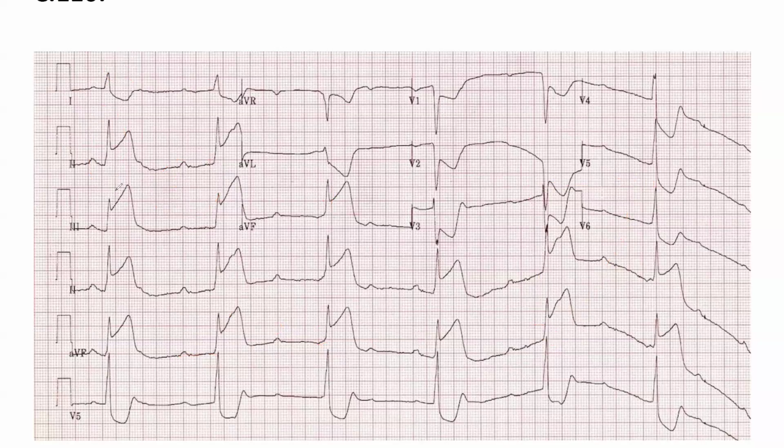And one thing, is the QRS wide? Not wide. Because from the beginning of the QRS till here, that's an ST segment, and this is a T wave inside. Next time we will practice with this one, that's an ST elevation only, an ST elevation MI. So the QRS is narrow. You can see that this QRS is narrow.